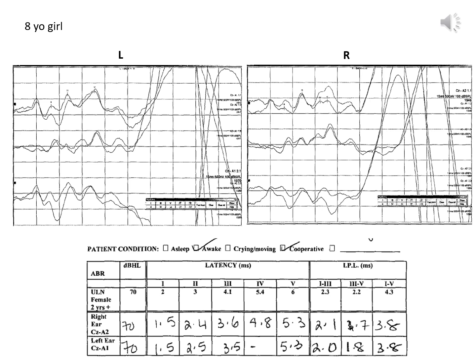And going down to our numbers, the technologist has filled in for us in the handwriting that this is recorded at 70 decibels for the right ear and also for the left ear.